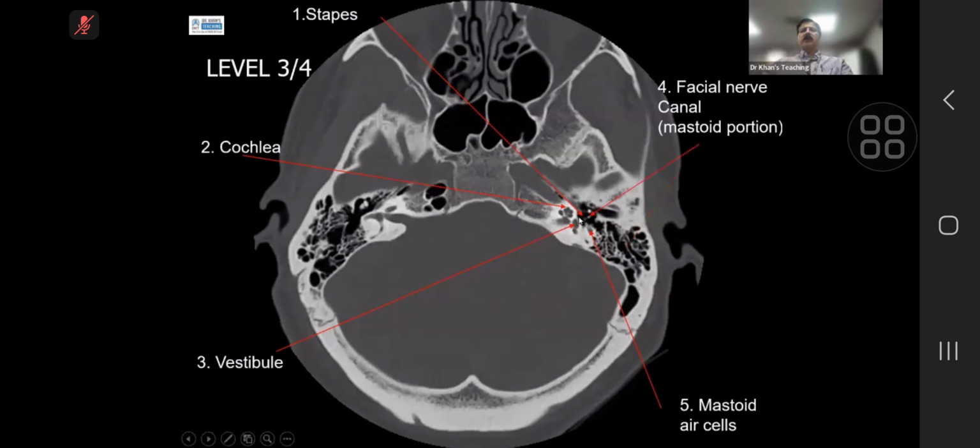I think this is a bit harsh for the simple reason that I can understand it is not projecting very well for you, stapes, and the arrow is slightly off. So it's a bit harsh. So I think I'll disregard that. The point was that the stapes is visible here. And this flower, of course, is the cochlea. This thing is the vestibule.